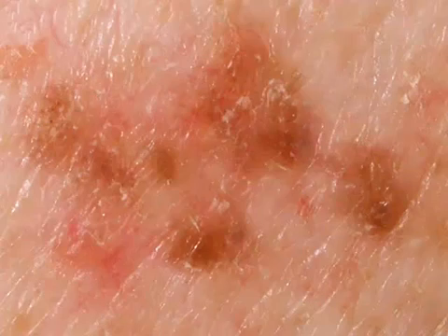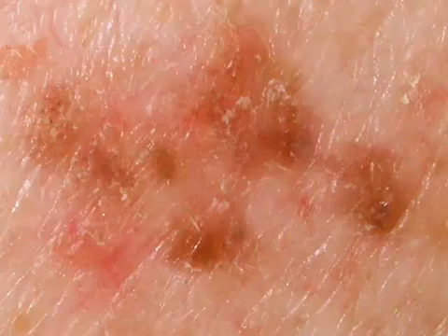This lesion here, clinically, is scaly. Dermatoscopically, it has only one pattern, structureless, and one color, that is brown. Now, it's not a solar lentigo, and you have to look for clues. It's not a nevus. The clue here in this lesion is that we have the structureless pattern, but also some coiled vessels identifiable here. So in combination with structureless brown pattern and coiled vessels, the diagnosis is pigmented Bowen's disease.